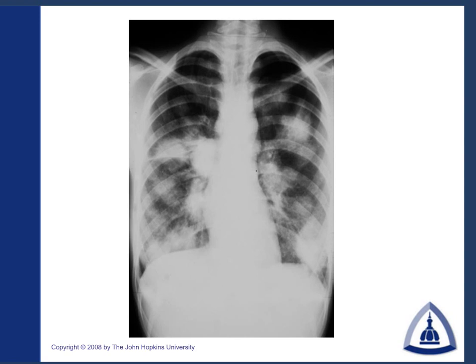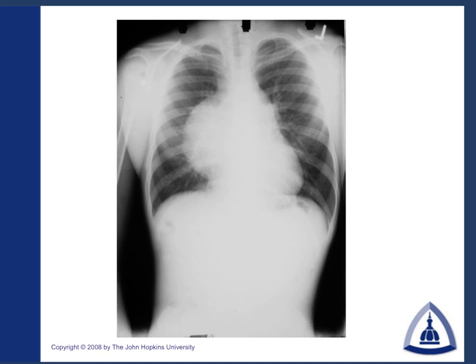This is a patient with nodular sarcoidosis, that has progressed to the point of being very diffuse and large lesions all over. This is a common board question.